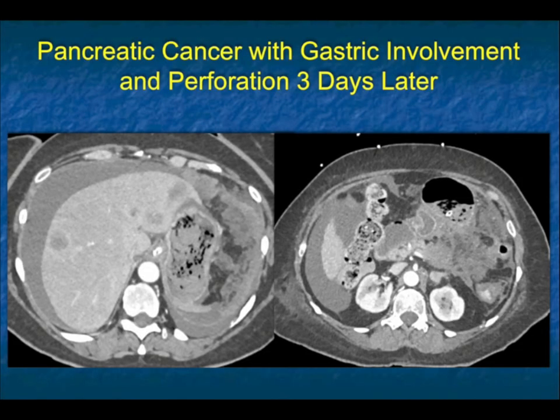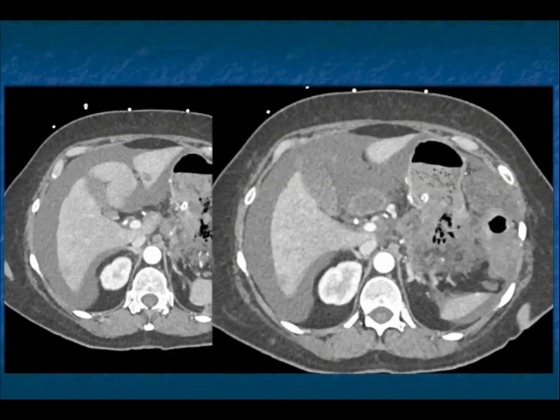Now, this patient was interesting. Patient presented with abdominal pain. You see carcinomatosis. There's definite involvement of the patient's stomach by tumor. There's liver metastasis. And you can see this is a pretty aggressive tumor, and you begin to wonder where the air is in the stomach.